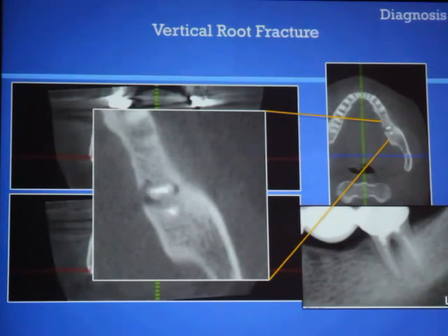Và cái tổn thương vùng chẽ rất là dễ hiểu thôi, bởi vì khi mà có cái tổn thương nứt dọc chân răng thì các hiện tượng tiêu xương nó sẽ đi theo rất là nhiều chiều và nó có thể đi phía xa cũng như đi từ phía gần của các chân răng này.